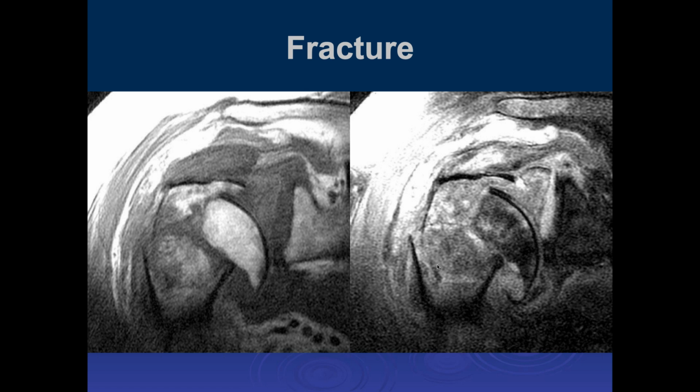Yeah, we'd need to see all the other images. It may well be, John. Yeah, we see the three, but it may well be a four-part. Yeah, good, John. But anyway, what would you do with it? John, let me ask you a question first. What else would you like to see in the radiology report? Mainly the displacement and the number of fragments. I don't go by the Neer classification.